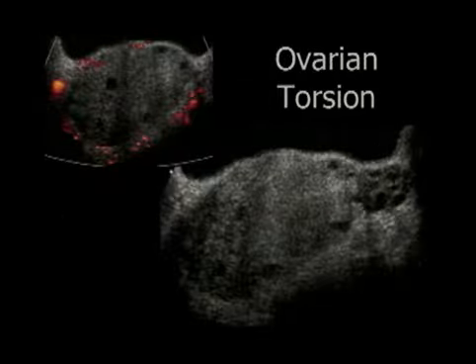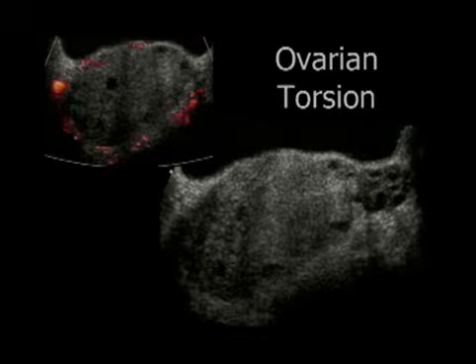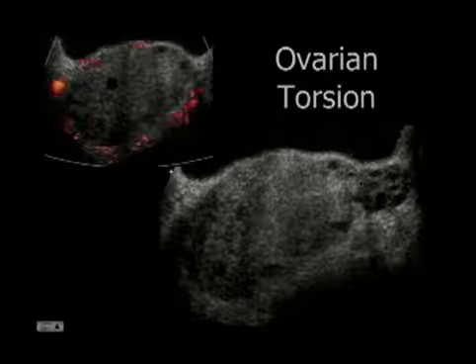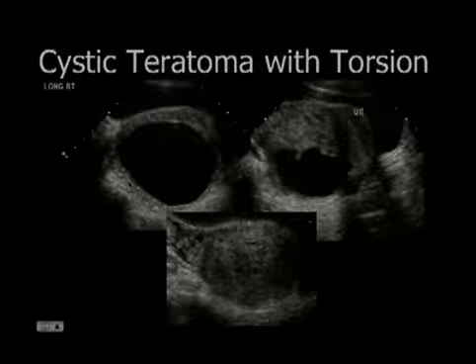So here's a classic case in a teenage girl with acute pain. We have a very large ovary with peripheral follicles, and here's the normal ovary for comparison. Certainly this thing is grossly enlarged and not much doubt about the diagnosis. This child also had acute pain, had a rather complex looking ovary, maybe some peripheral follicles. We did not see any calcification or fatty mass.